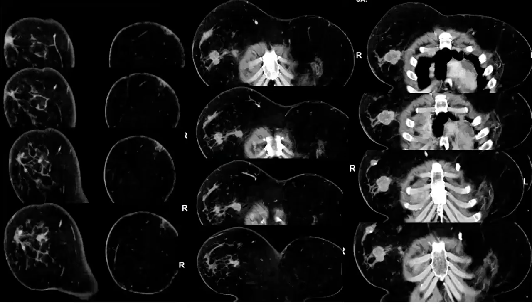So can you see any nipple here? Okay, this also, we can use the multiplanar CT for local staging. Here, can you see the nipple enhancement and how the adjacent nodule is extending? This is an enhancing duct. That is the same duct from this satellite nodule extending into the nipple with enhancement, which makes it more suspicious for nipple involvement. And these multiple satellite nodules interconnecting.